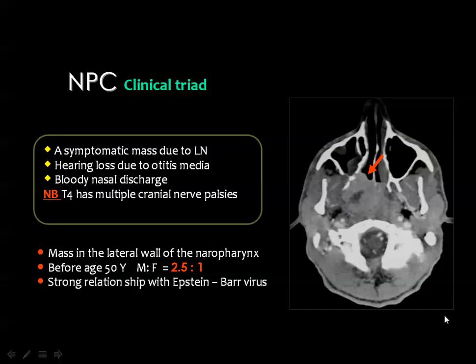Then what are the symptoms of nasopharyngeal carcinoma? Look at this image. You see a very big mass heterogeneously enhancing along the medial aspect of the parapharyngeal fat, extending into various directions. I will mention these directions in a moment.